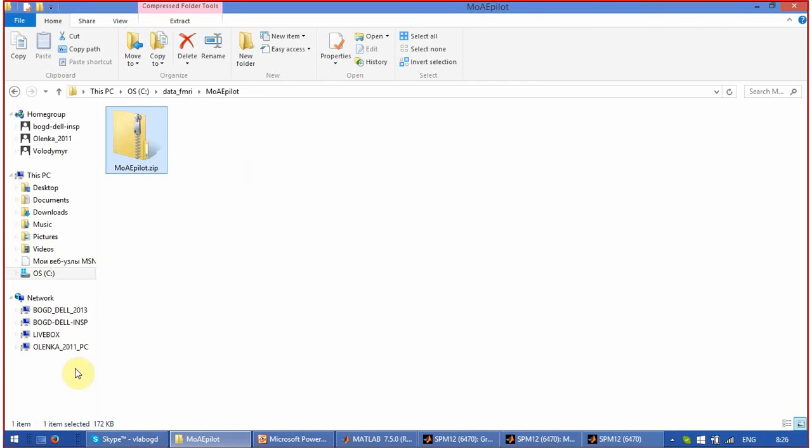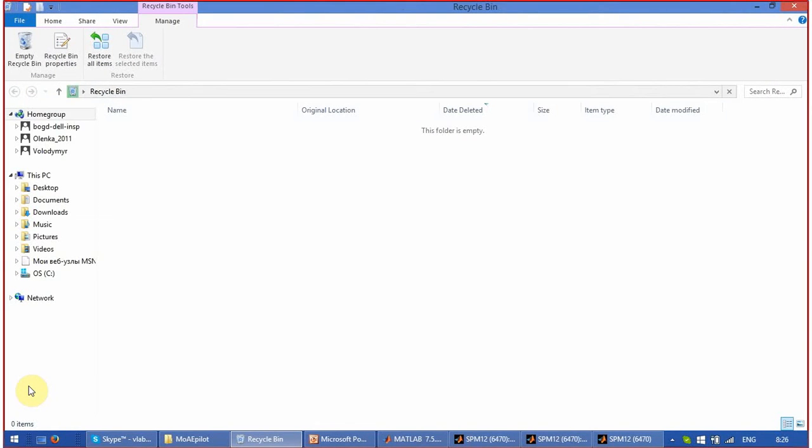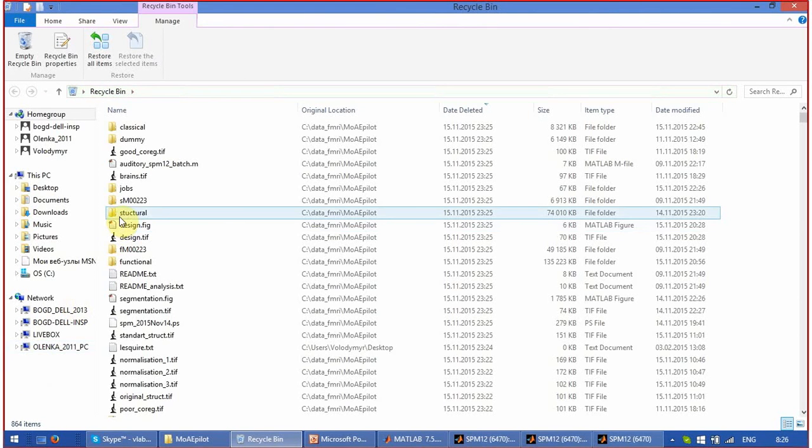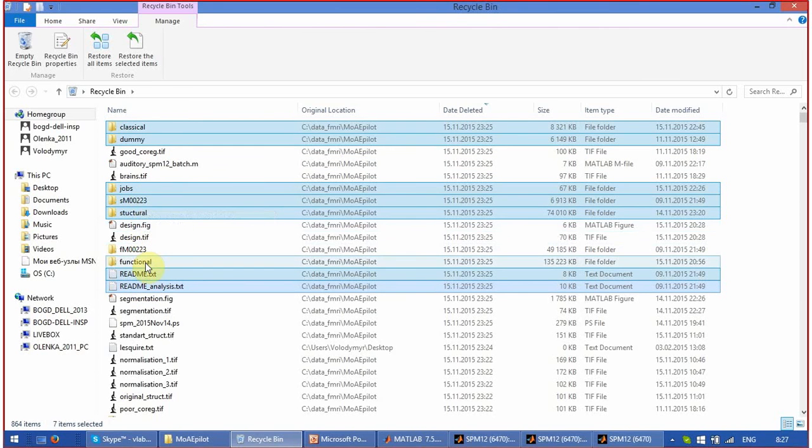Okay. The troubleshooting. I will have to restore the folders that I have deleted this morning.